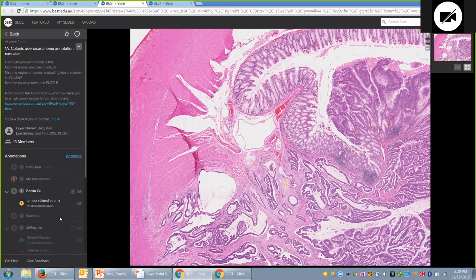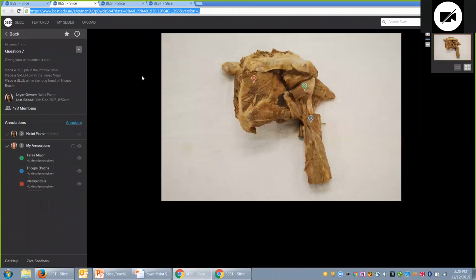This tool doesn't work as well when you've got an anonymized layer because you're only turning on or off all annotations in a list. You can, however, turn them all off, such as this example, and turn individual annotations on as you review them. That allows you to review a very clean version of a slide.